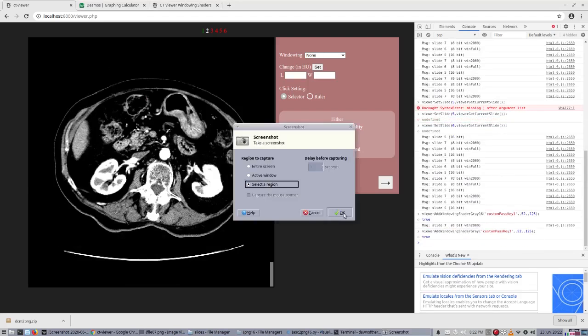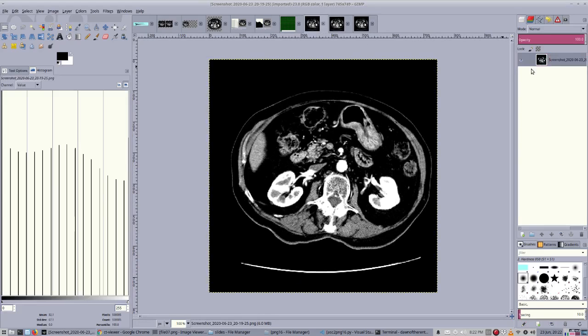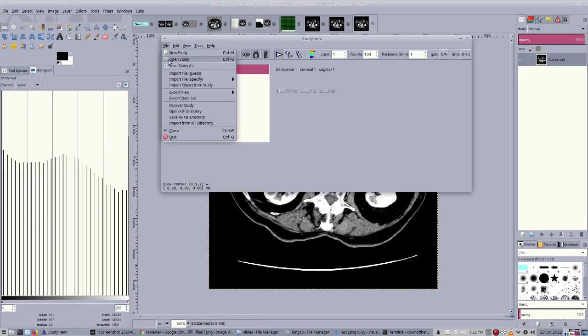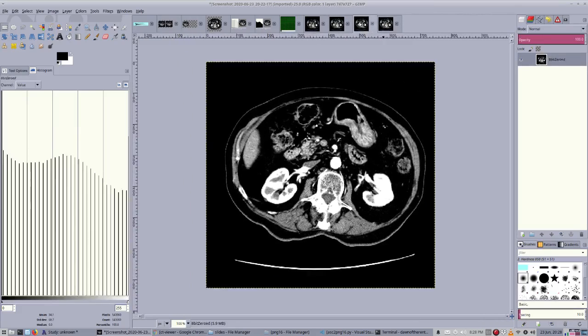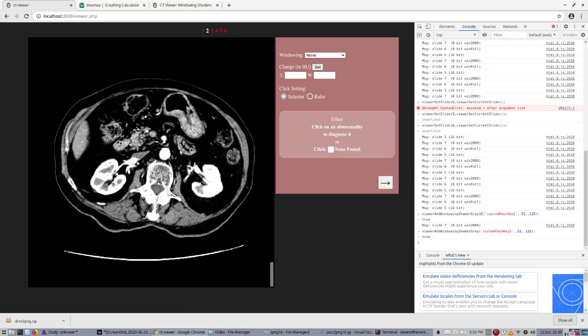And we can see that the zeroed image is missing a lot of values, and the full image is missing even more. But notice that the images still look relatively similar. And if we look at the image from a DICOM viewer, it is also missing 5 values. As we cycle through the images, you'll notice that even though the number of values they use vary wildly, they all look pretty much the same. So now we're going to go into the different features of each of these windows.